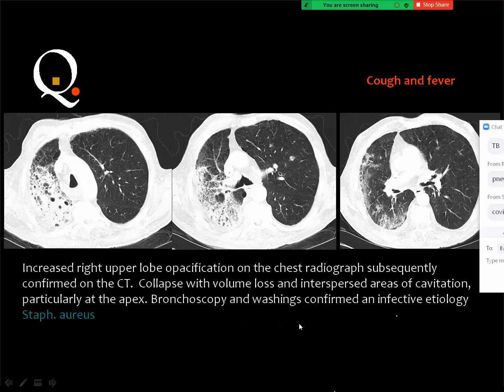And you know that I emphasized the RSNA guidelines for the diagnosis of COVID infection, and this should not be mistaken for any other forms of pneumonia or other forms of diffuse lung disease.